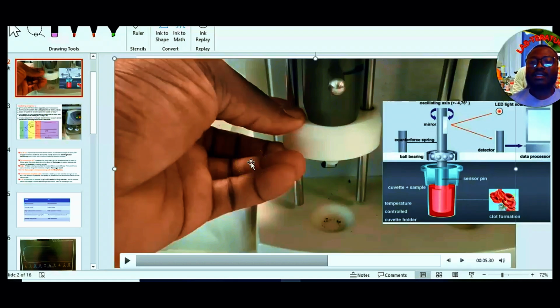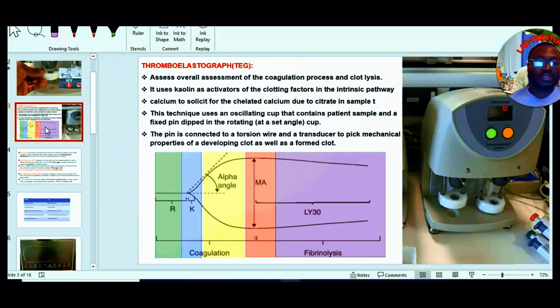Now, understanding how the test is performed is just a portion of it, but interpreting the graph according to the clinical circumstance is top notch, and I would be able to guide you on that. You will do a very simple interpretation, also get good examples and elaborate on it.